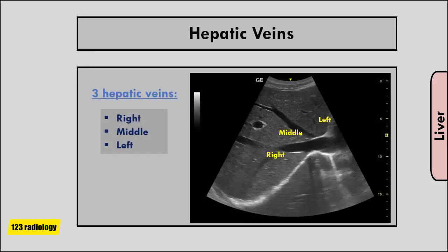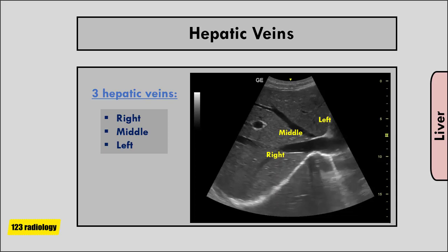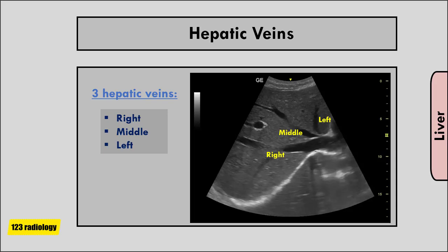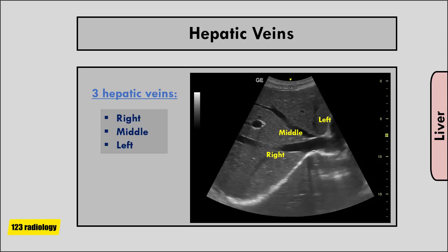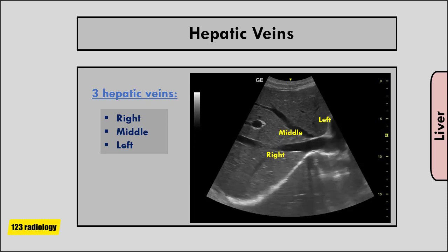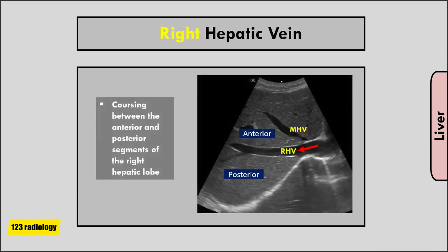Understanding vascular anatomy of the liver is essential to appreciate the relative positions of the hepatic segments. The major hepatic veins course between the lobes and segments. They are ideal segmental boundaries, but visualized only when scanning the superior liver. There are three hepatic veins: right, left, and middle. The right hepatic vein runs within the right intersegmental fissure and divides the right lobe into anterior and posterior segments.